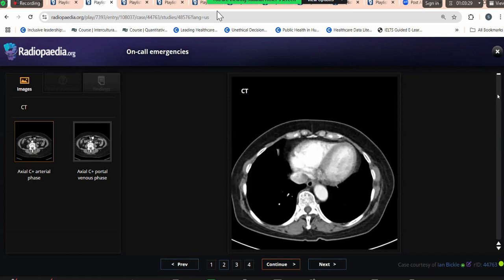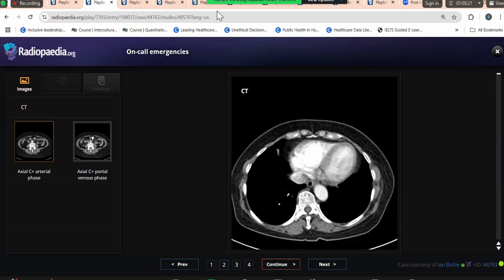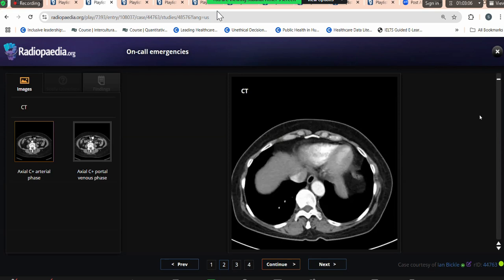So I've been presented with a CT scan of the abdomen of a female patient who has presented... Sorry, ma'am, I just forgot the history. Can you please repeat the history? No, nobody will repeat the history. It's your luck. This is practice. Don't worry about what you do right now. All this will be your learning points. If you have forgotten the history, you will remember it now at the end, and for your next Viva. That's fine. Go ahead.